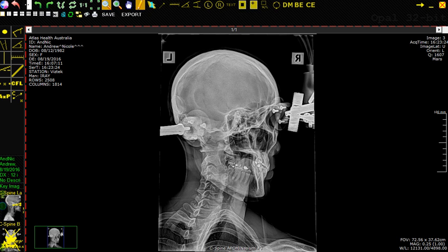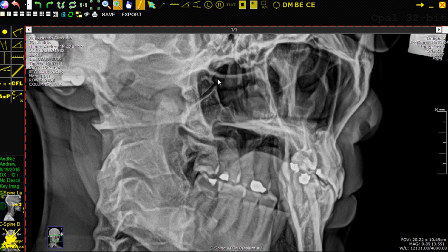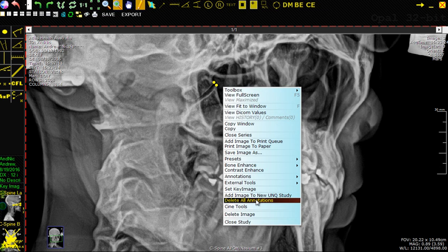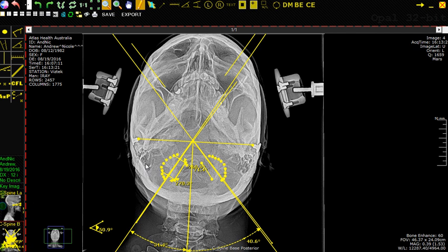Now this is a case of a person that I took. Both of this person's are extremely sharp, very easy to see joint margins. And I think you can see on both sides, this is a textbook normal because there is no overlap and there is no underlap of these joints. But this is the importance of having all of the angles right on this tool and on this x-ray right here. So I hope that covers it.